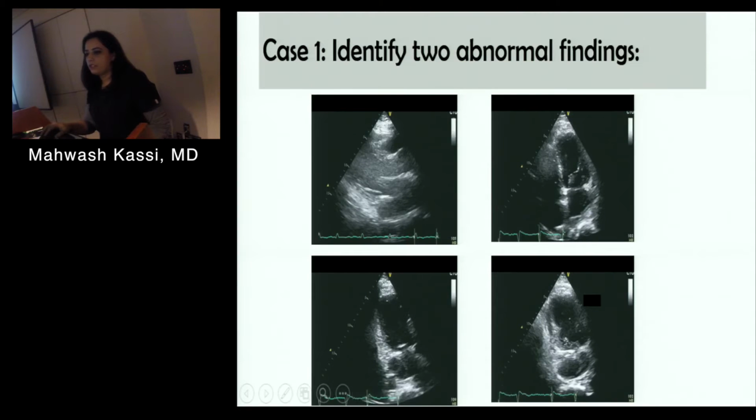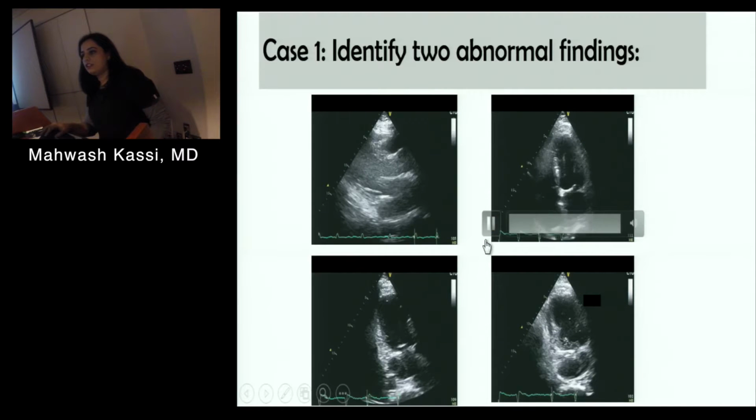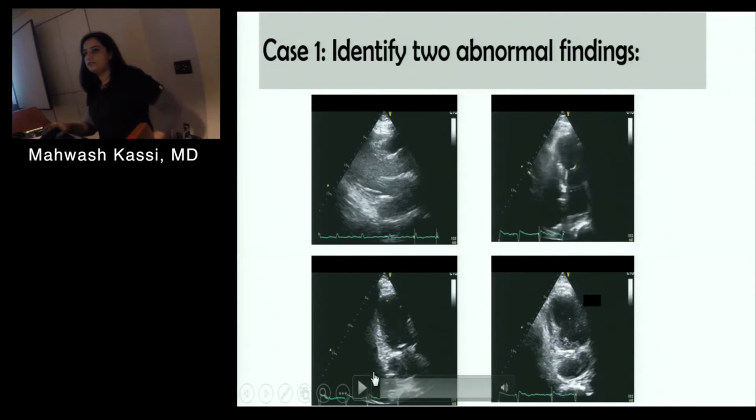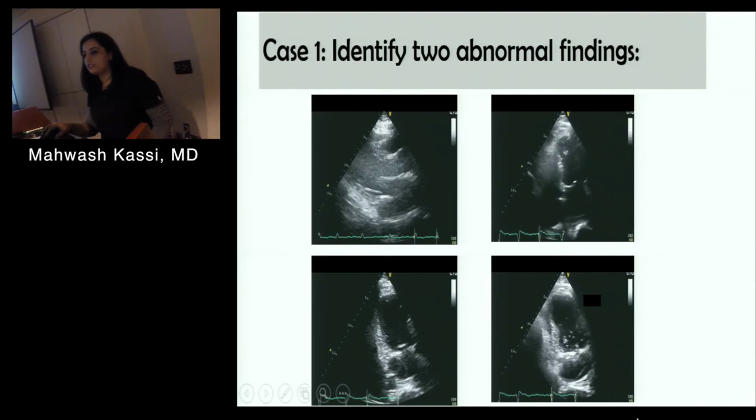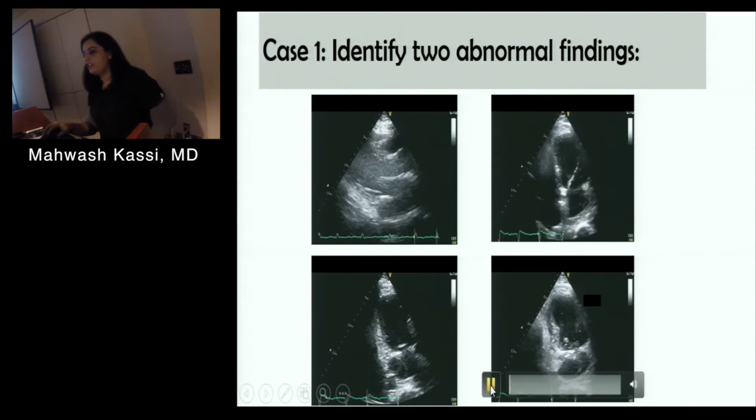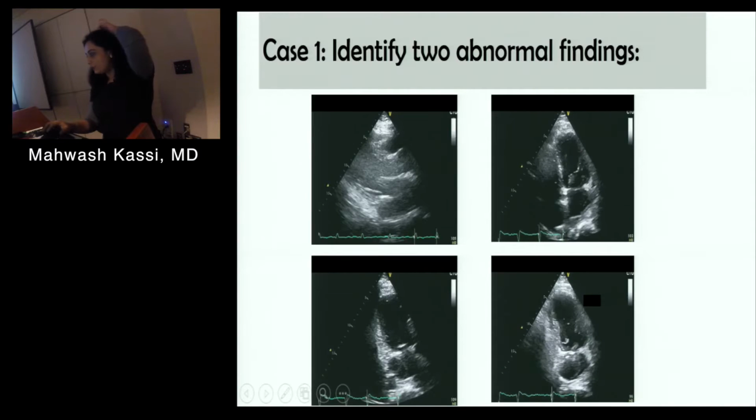So one other abnormality, if we can see, is what he was mentioning about the apex. Based on the contrast, yeah. So maybe I'll play the one that I think is a little bit more suspicious, and redirect your attention to the left atrium.